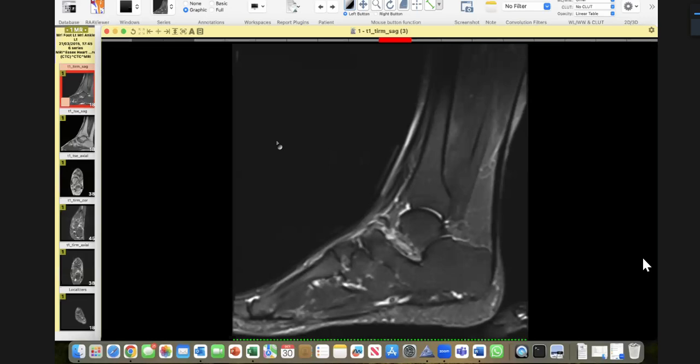So, sir, I will inform my finding to the referring physician and would refer this patient to orthopedics for further management of this case. Anything else you are going to advise? Sir, a bone scan can be done to see if there is any uptake since the patient has a history of pain. Since MR is very sensitive for edema, and I cannot see any edema or any abnormal collection of fluid in this region, this is less likely to be due to any infective etiology or any other.